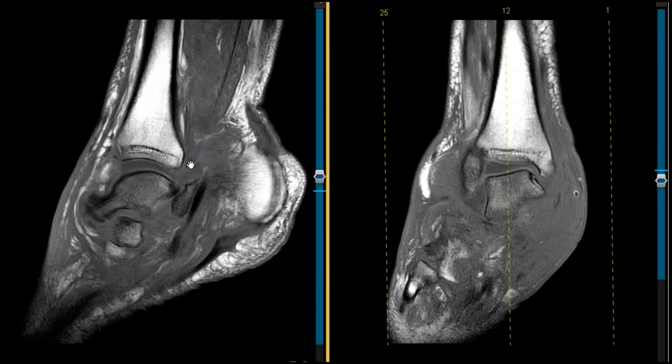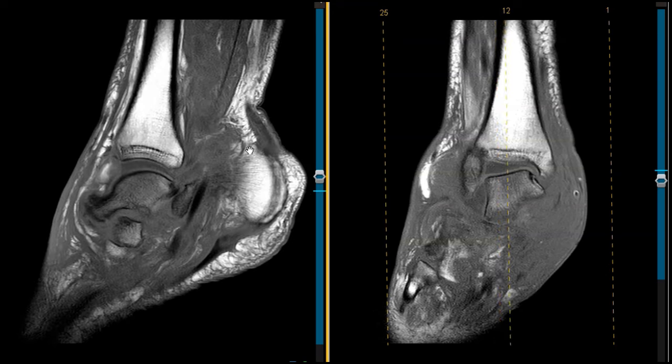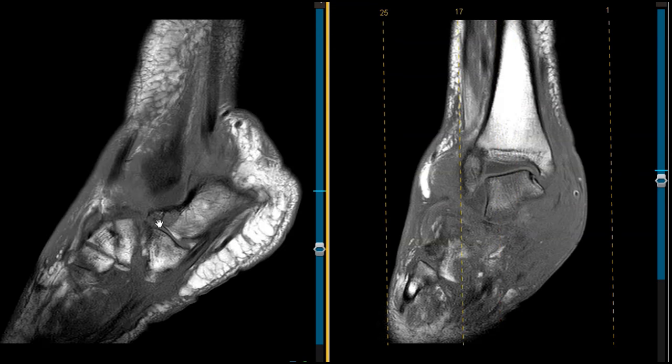see the calcaneus on the sagittal view. This is the back of the calcaneus, the back of the heel, and this area here normally is far below the ankle joint, or a little bit below the ankle joint at least, but here the ankle joint, and this is above. So this is abnormal high position. It's related to this talus dropping down, being dislocated. We also see marrow edema again throughout these bones. This is the anterior calcaneus.